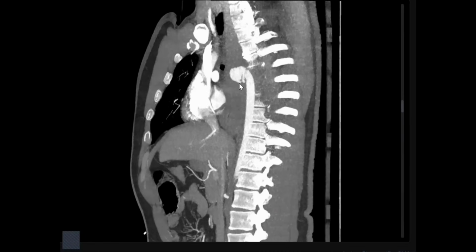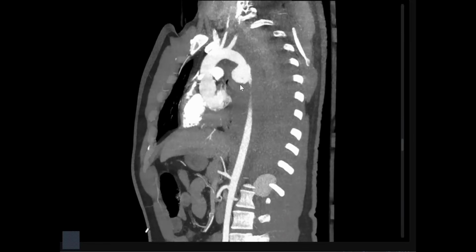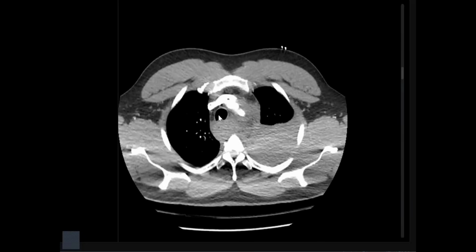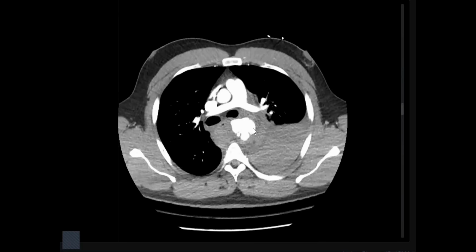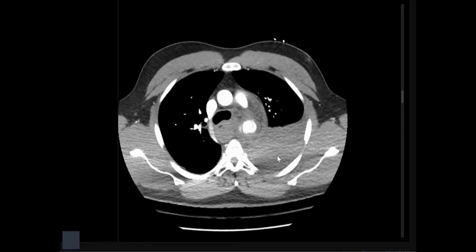Actually, this is not an aneurysm. In the setting of trauma, if you see a focal dilatation with irregularity, we call it what? Pseudoaneurysm, not a true aneurysm. Very good. So it's active extravasation and pseudoaneurysm formation, and here the wall irregularity and this is a focal defect, associated with.